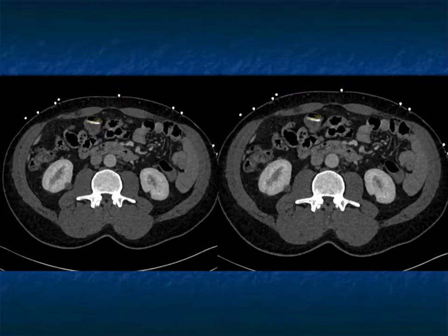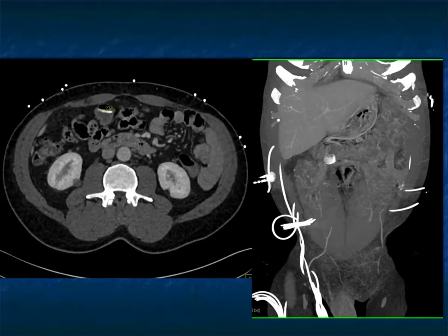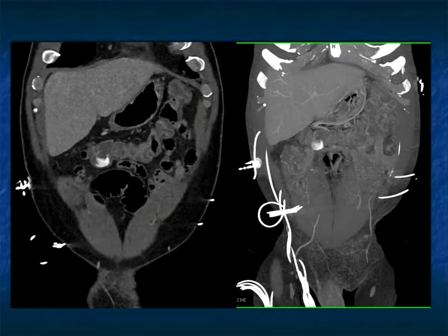Sometimes it does increase in terms of number. But again, one helpful rule, it always changes. When you're dealing with high density material that's foreign matter, not blood, it always stays the same. And again, here you can see on the MIP imaging that almost looks like a rectangle of blood very nicely layering out, and the increase between arterial and venous phase imaging.